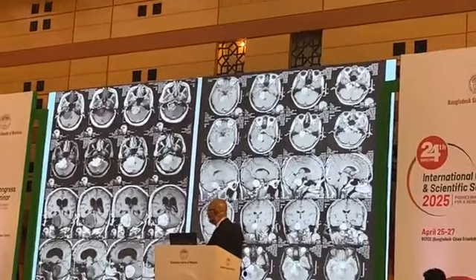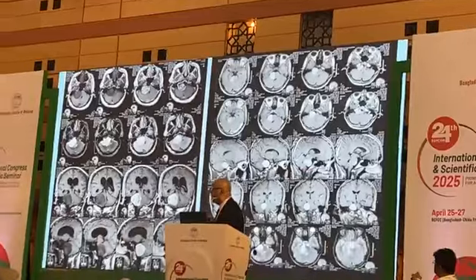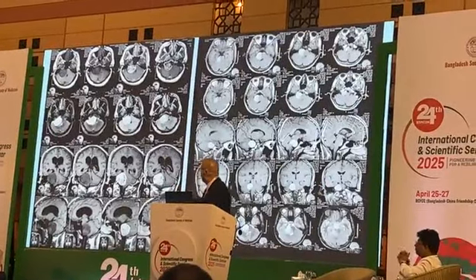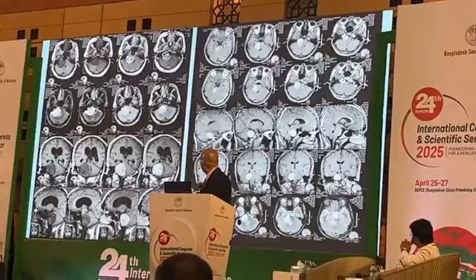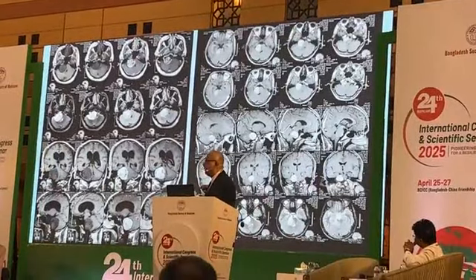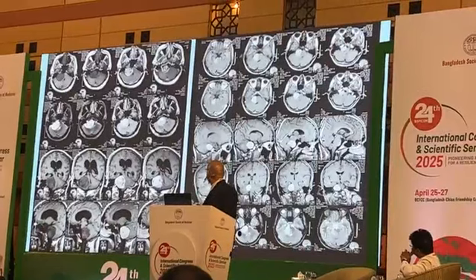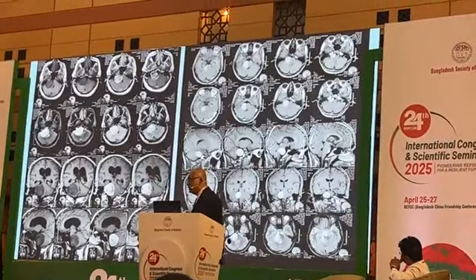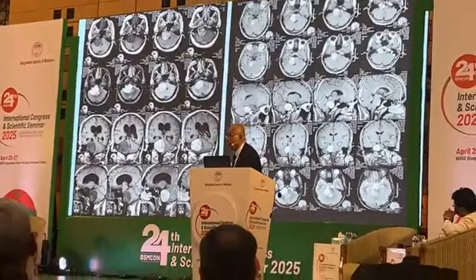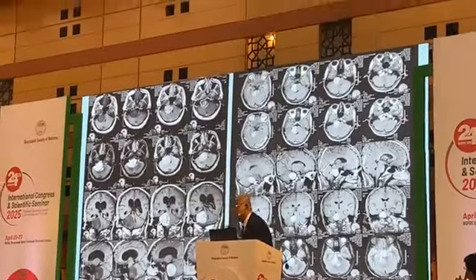So these are two examples of acoustic neuroma. If you are given the possibilities, I would place acoustic neuroma or vestibular schwannoma as number one in this case, and meningioma as second. I will place meningioma here as first, and vestibular schwannoma as second, to get the full marks.